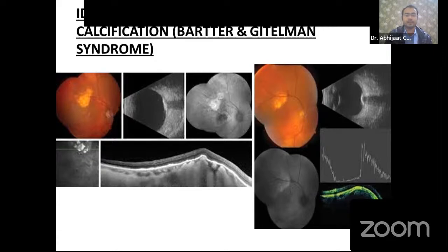And it presents with the similar pattern in which our patient presented, and it presents like a sclerochoroidal calcification, as can be seen in this OCT scan, that a calcified choroidal lesion is present here. And the B scan which I showed, again it shows that peculiar lesion with a pseudo-optic nerve head sign.